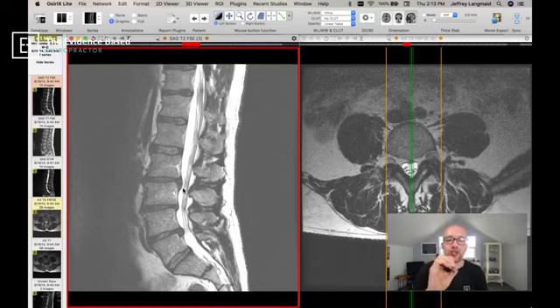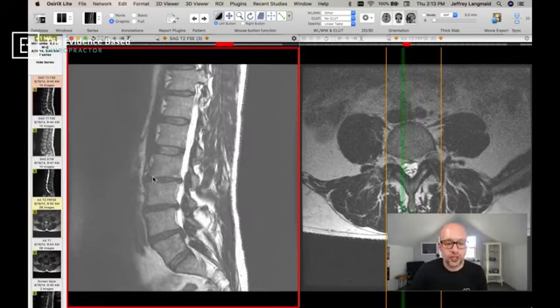And the foraminal canals, or where the nerves travel out the side, where we'll see the pinched nerve, those holes, those canals are even smaller. So here we have the disc poking out the backside here. As we go down towards the next level, we can see a little hump out the backside there, a disc bulge there. And what do you know, we have one here as well. So there are a couple different levels at first look that indicate we might have a problem where the nerve is traversing out. One of the great things about the lumbar spine is you can stay on your sagittal view and just go out towards the side.